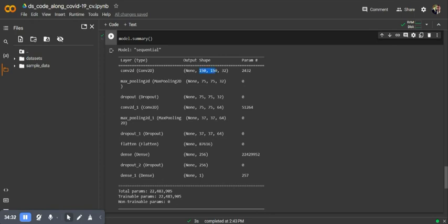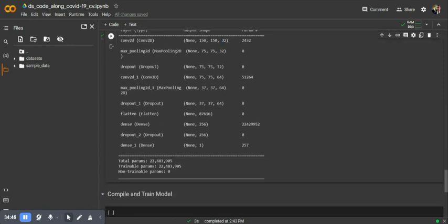Okay, on the conv layer, the input shape 150 by 150, and the 32 is because we created that layer with 32 filters. Again, the pooling layer, we've got 32 filters, and it now says 75 by 75, which basically means it's downsampled the image. And then when we hit the dropout, it stays the same. That is just basically switching off the neurons.